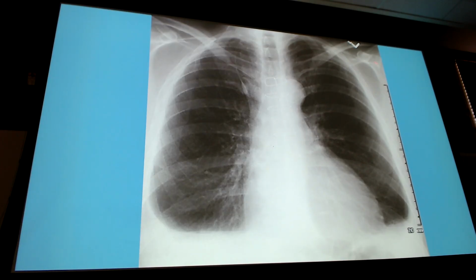8 posterior ribs. So let's count them together. So 1, 2 here. So 2 comes up. So 1 and 2. So 3, 4, 5, 6, 7, 8, 9. I mean, I would even technically count that 10 just because I can see it go over here and I know it's fluid. But either way, I have at least 8.